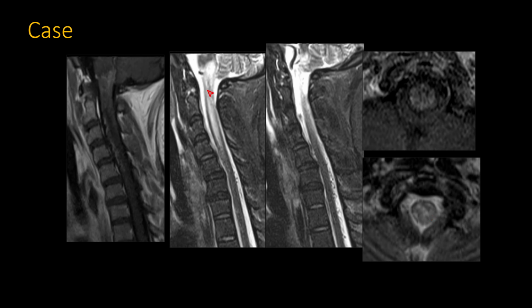Now this, just based on the findings I just described, would actually be a pretty good look for neuromyelitis optica, because you have longitudinal extensive myelitis and it goes all the way to the area postrema, which is a pretty characteristic finding, supposedly, of neuromyelitis optica. But what's different about this case is the presence of these low signal areas lower down in the spinal canal, which are extremely crucial to detect, all these little squiggly low signal areas.